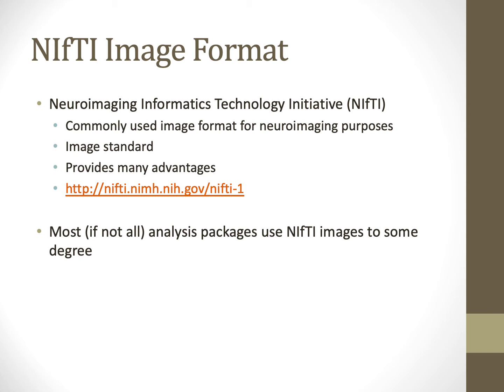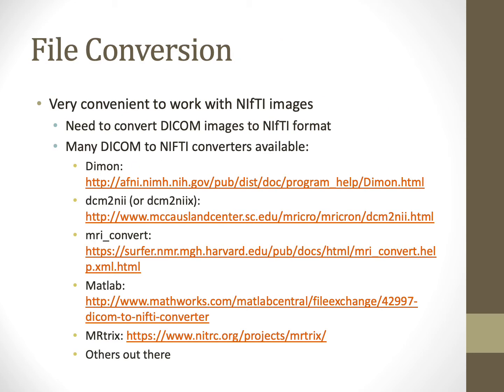The majority, if not all, of analysis packages for neuroimaging analysis use NIFTI images to some degree. It is very convenient to work with NIFTI images. However, this requires us to convert, as the images that we acquire from our MRI scanner are stored in a DICOM format, so it is necessary to convert our DICOM images to a NIFTI format.